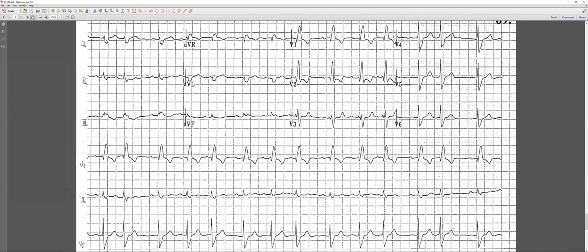So it's here. You can consider it sinus. No, supraventricular beat. Supraventricular for sure, because you do see P waves. However, it's not coming from the SA node, so it's not sinus. It's not coming from there because of the wide QRS. No. Then because of the morphology.